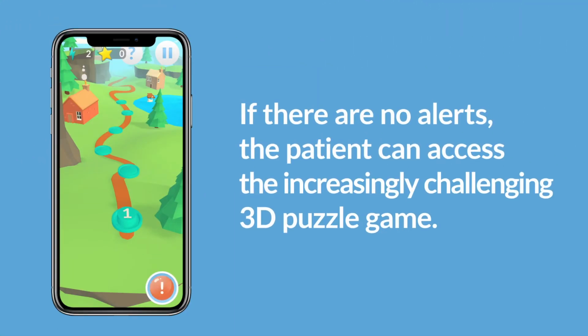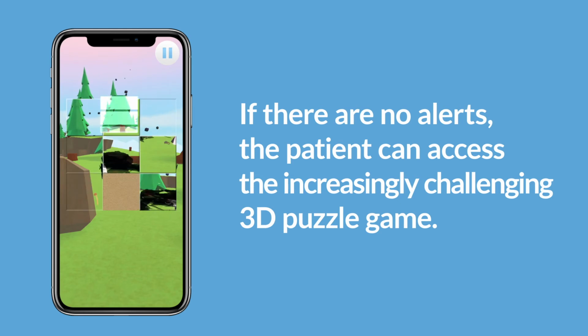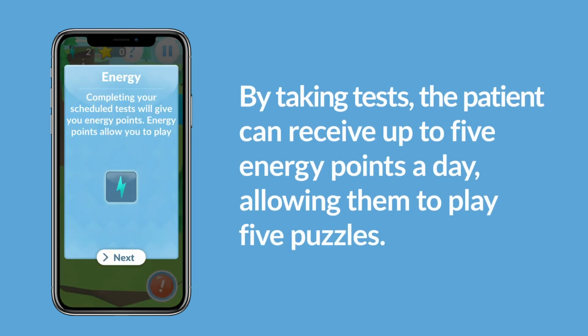If there are no alerts, the patient can access the increasingly challenging 3D puzzle game that adds depth to the experience and ensures engagement. By taking tests, the patient can receive up to 5 energy points a day, allowing them to play 5 puzzles. To keep playing, they will have to take tests regularly.